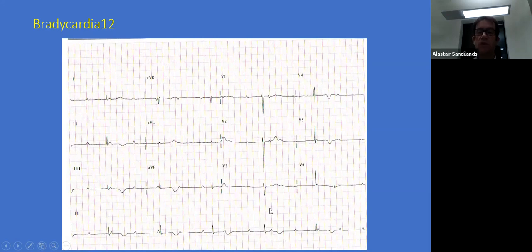Narrow escape rhythm. Okay. Yes, the T wave is very prolonged. You might think this is a really prolonged QT interval, but for the given rate, it might not be too bad. This is actually a patient that had a pacemaker put in that was taken out. So they've got these things called T wave memory changes. We're not too alarmed by this. They're waiting to have a new pacemaker put in.